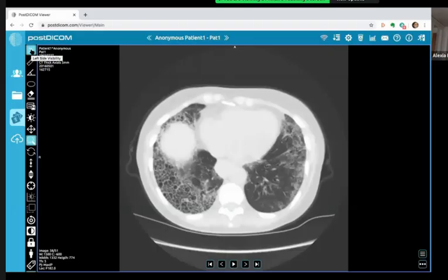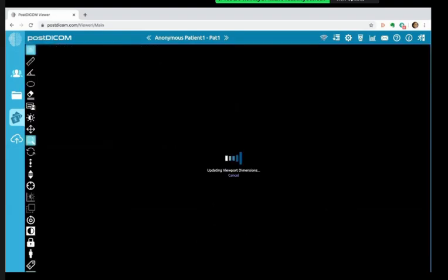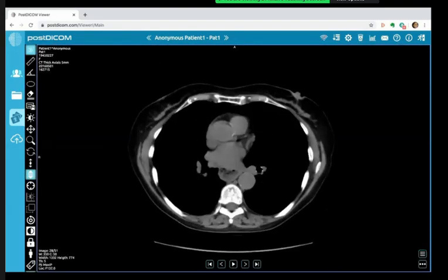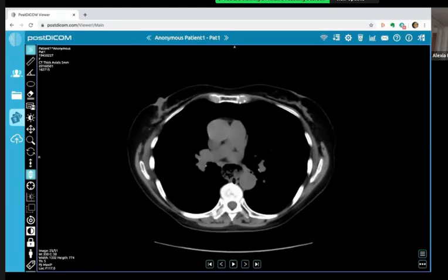Systemic sclerosis. So I would check for other symptoms of systemic sclerosis and CREST syndrome as well, whether this patient has got CREST syndrome. But the findings here are fibrosis as part of the systemic sclerosis and esophageal dilatation. Well done. So that's the key.